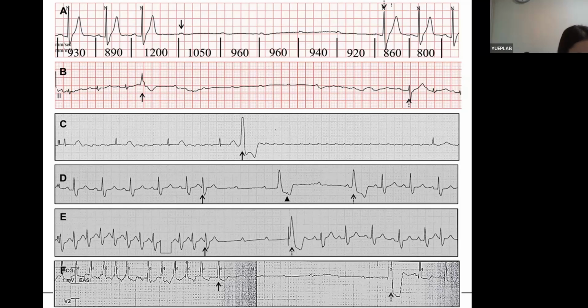But as far as I know, the block is raising of the basal membrane potential, so it should show a consecutive conduction block. So a single block may be related to PVC-related AV nodal refractoriness. Of course, this patient definitely has a conduction disease. Definition-wise, the mechanism may not be phase 4 block.